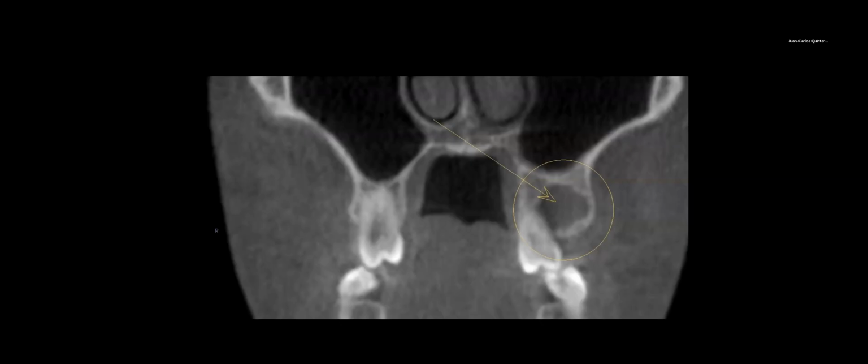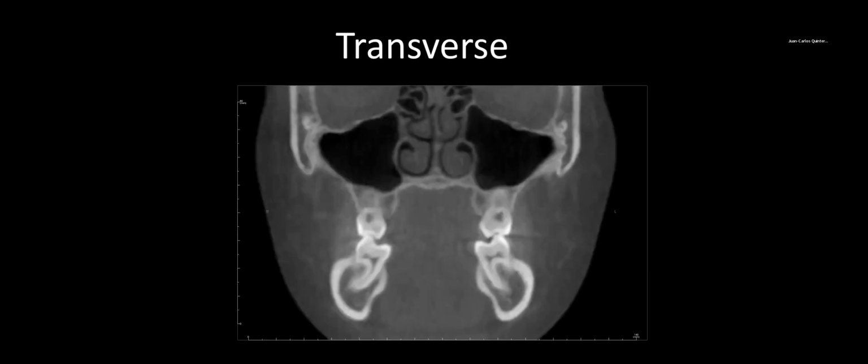Okay, how about the identification of pathology, right? A lot of times, incidental pathology comes up in the absence of symptoms, right? We will be the first to discover certain lesions. And you can't do this with the same day start concept, right? So you pick up these problems on patients when you really take your time and dissect the data. So we're able to see the transverse. So in this particular case, if you just look at the models, like study models, plaster models, does this patient have a transverse discrepancy?